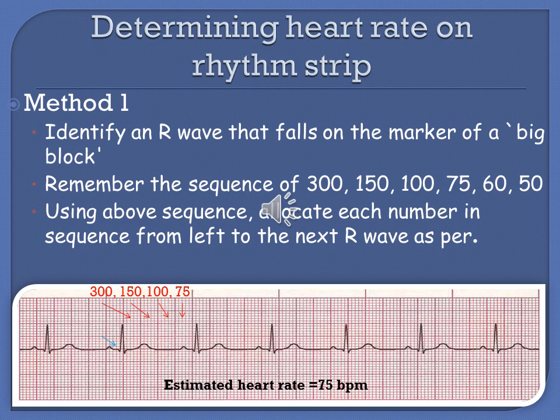Second, you need to remember some numbers in sequence or order of 300, 150, 100, 75, 60 and 50. So what did I say? 300, 150, 100, 75, 60 and 50.